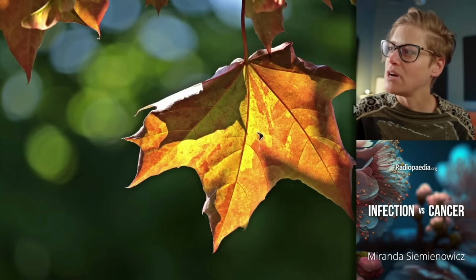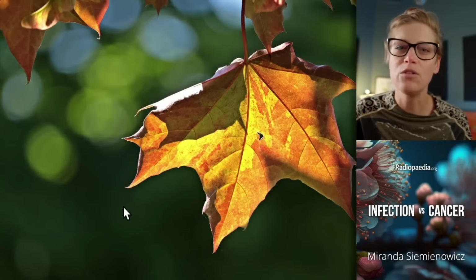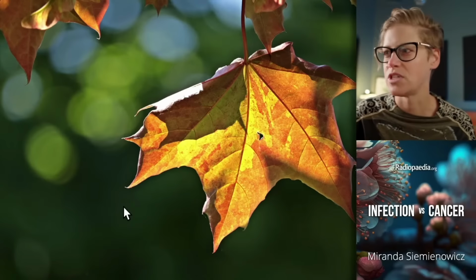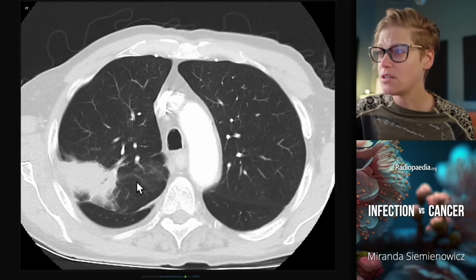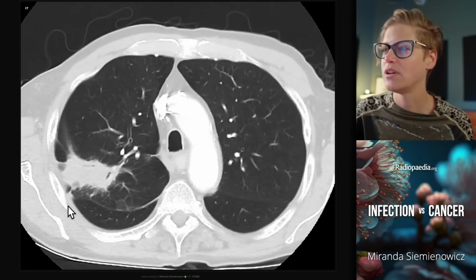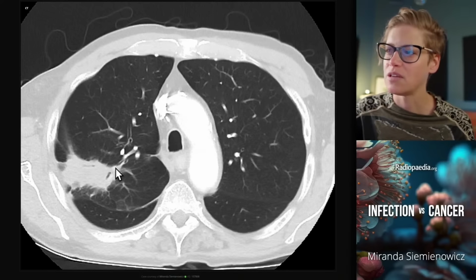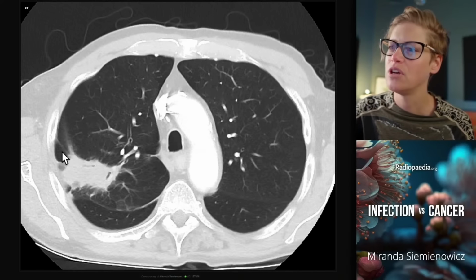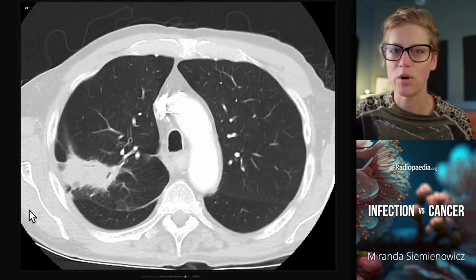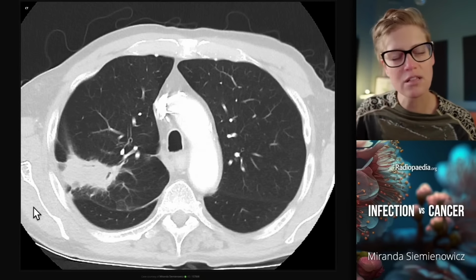As those polygonal margins begin to organize, they become scalloped, rounded, and concave, and we look for that when we assess the lesion morphology. So here's another lesion, this time in the right upper lobe, a focal opacity in the lung, and when I scroll all the way through it, you can see these beautiful concave margins. And this, again, is a clue that what we're looking at is a post-infectious focal organizing pneumonia that's becoming retractile, and that scalloping is typical.